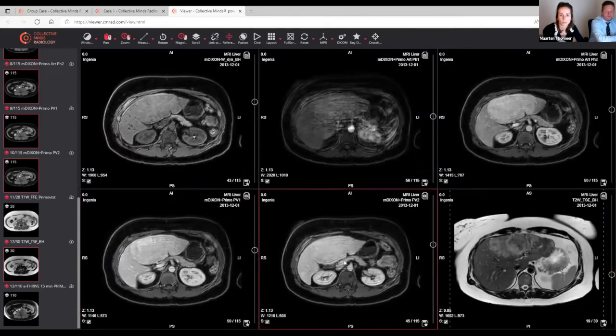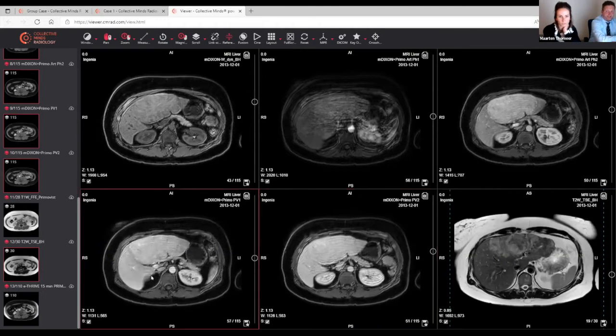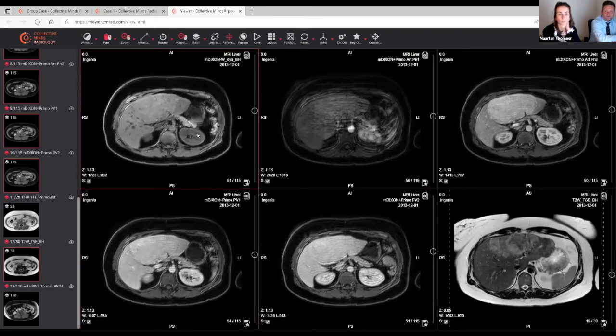So this is an MRI with Primovist. I think with non-liver-specific contrast agents, you would expect it to be hyperintense compared to the liver. But now we use Primovist, and that's the reason why it's not hyperintense to the surrounding, because there's already uptake in the venous and the transitional phase in the liver. But if you know this drawback, it's not a diagnostic problem. So your diagnosis is what you find on diagnosis.